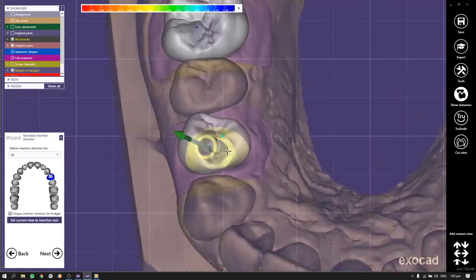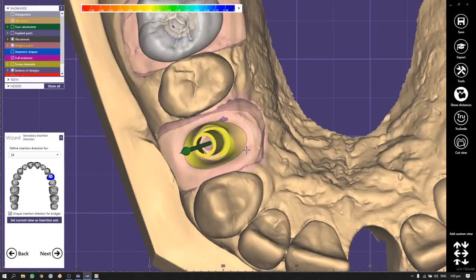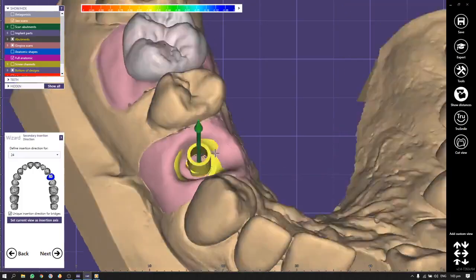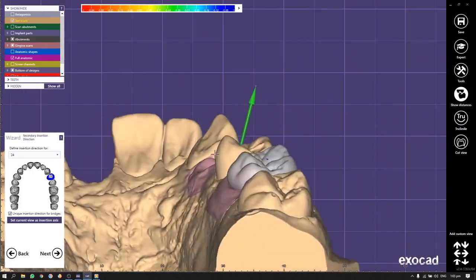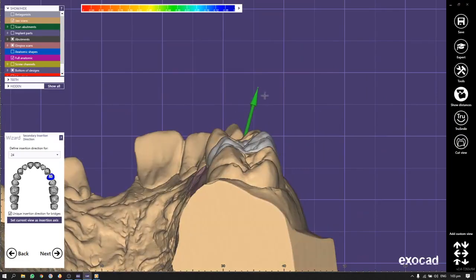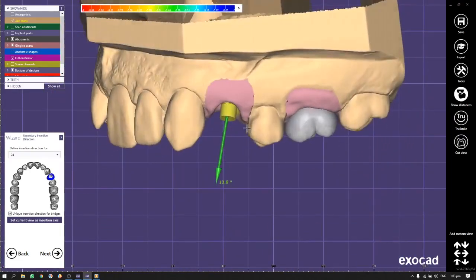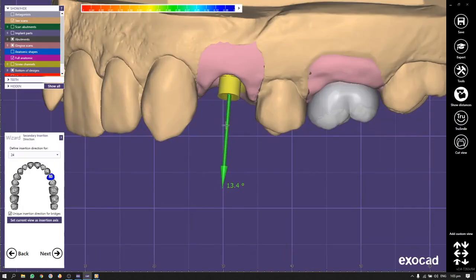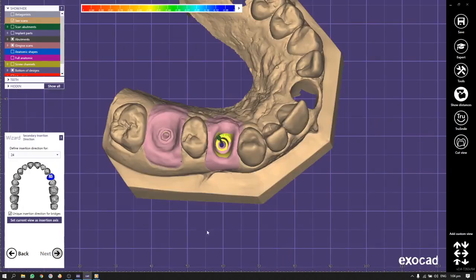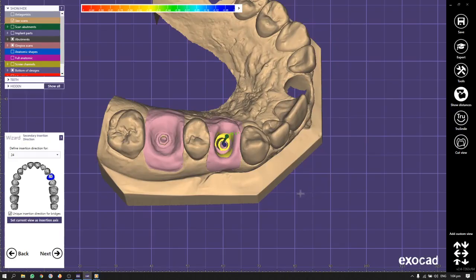And right now we're going back to abutment. Right now the program proposes to us to manually define the angulation of the abutment. It's not the shaft but the abutment. So the way we want it would be situated into the arch, not the shaft but abutment. In some scan abutments you can change it, but not here. So if we have on this stage not one but 3 abutments where we want to make one bridge, we have to create these abutments with the same inclination.